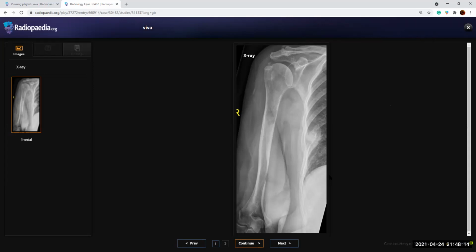So in summary, this seems to be a pathology centered in the thorax with metastatic lesion to the humerus. I would convey the finding to the clinician, activate the cancer tracker pathway, and would advise a contrast enhanced CT chest to further evaluate this lesion.